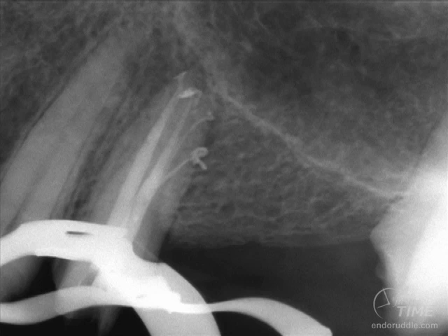We shouldn't fret what's in the lateral canals. It could be all gutta percha. Certainly, it could be all sealer in the really small ones. Usually, it's a mixture. And you'll have a little gutta percha in part of the ramification, but as we get further away from the heat and the force of condensation, the little plunger of gutta percha will piston sealer on out to the cavo surface.